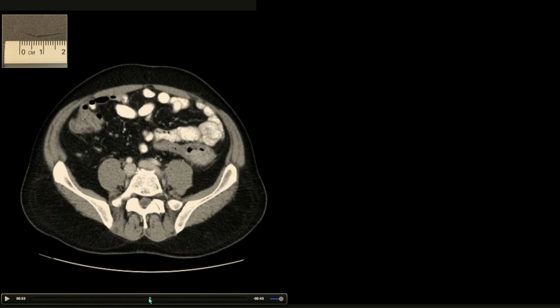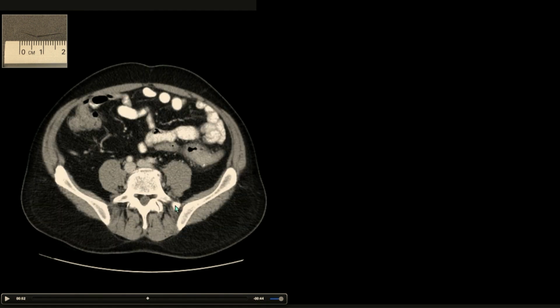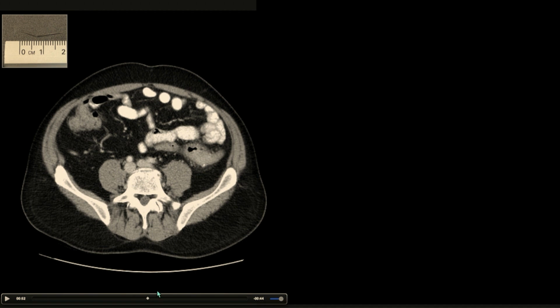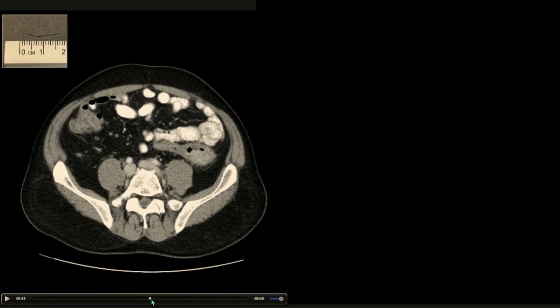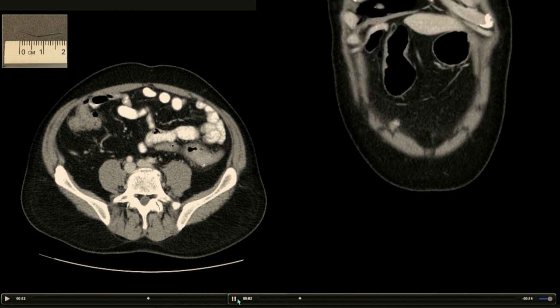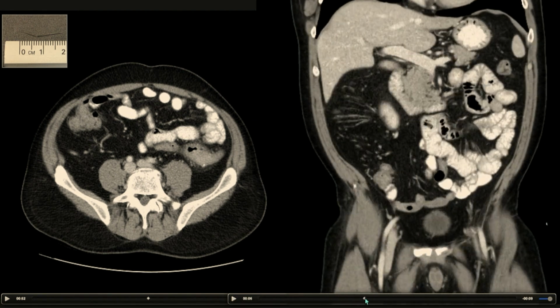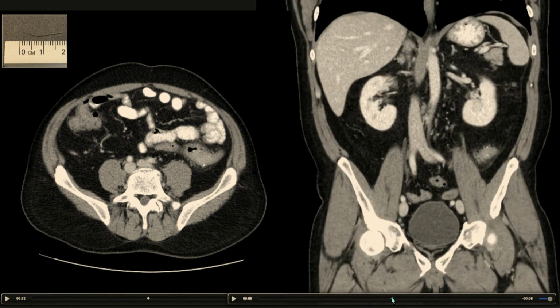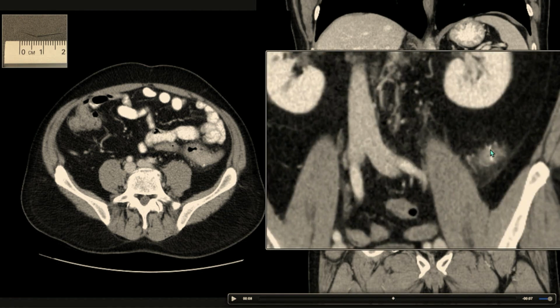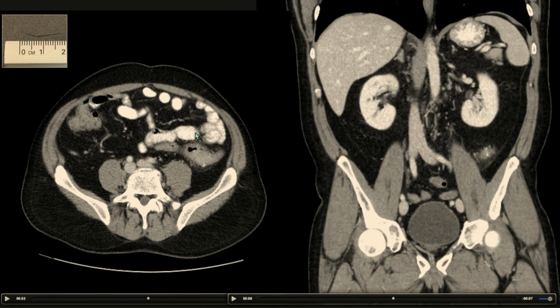So this patient came in, we do our diligence, and we find this thickened segment of colon here. And along the posterior margin is actually that grill brush bristle that they removed. I have the pathology picture in the upper corner. It almost looks like a hyperdense vessel, but obviously the vessels aren't quite that bright. It could be easy to overlook, called diverticulitis, or maybe even an intramural abscess. Oh, here we go. Scrolling along that posterior margin, you get a sense that you really have to have a high awareness of the potential of a dense foreign body like this. But this was that metallic bristle.